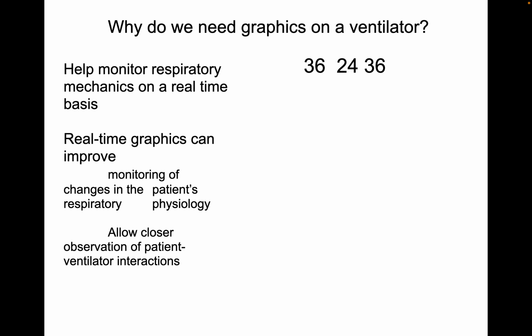This is the maximum volume achieved during inspiration, which is the tidal volume, and of course the entire volume will be the functional residual capacity. PIFR stands for peak inspiratory flow rate, and PEFR stands for peak expiratory flow rate, and we will see how clinically it can be of use.